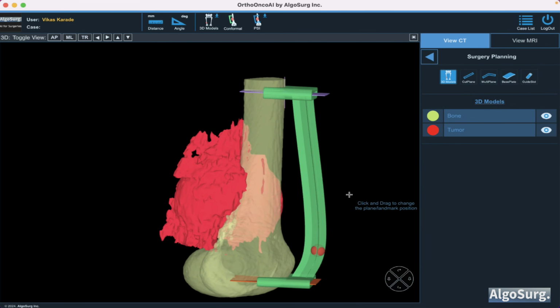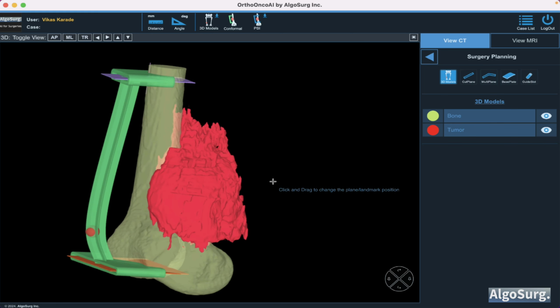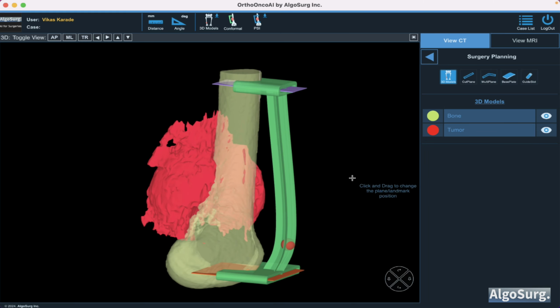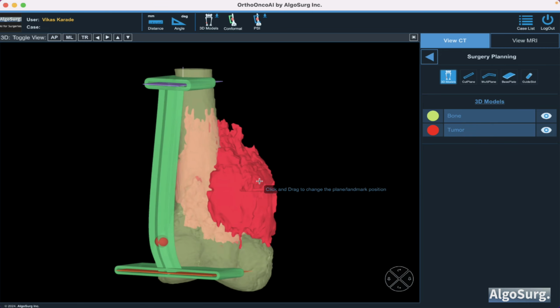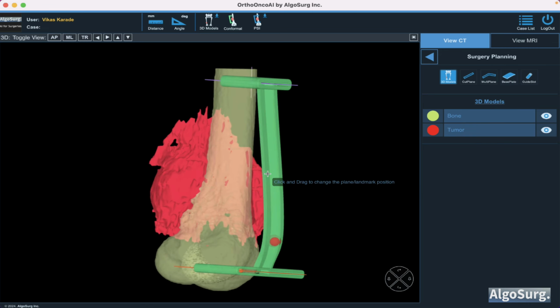All right, that's it. So a lot of things will be done here. A lot of new designs and parameters will come. More complex structures will be able to be made in this software very easily. Then the software will have its advanced version with the PSI design capabilities. Thank you.